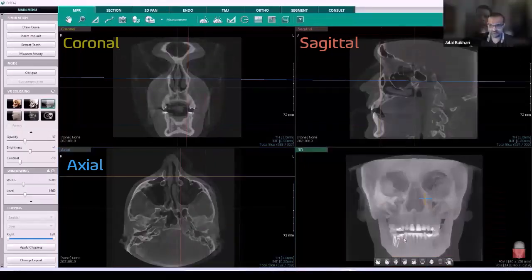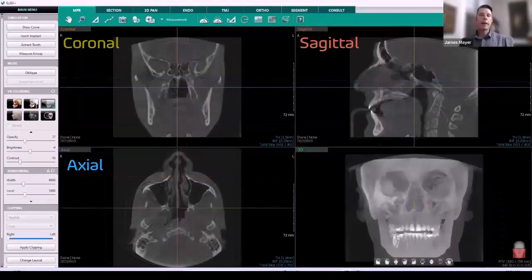So Dr. Carr, we have our volume open here, and we've reviewed our 3 sections of view and our 3D rendering. Let's go through a workflow of where do we start, and let's define some points of keeping this consistent and really repeatable, so we can go through each scan essentially the same way that we do for every scan, and get that into what I could almost call a habit of just, this is the workflow we're going to do.